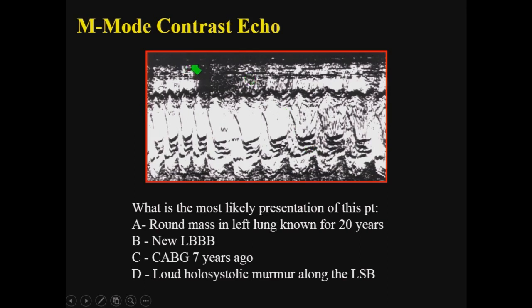Now, this is fantastic information, but don't do it. The actual recommendation is not to inject contrast if you know about a right to left shunt. If you know about right to left shunt, you should not inject even bubbles. But again, I don't think this will be shown to you in the exam. This is something to think about, another fantastic use of M-mode echocardiography.